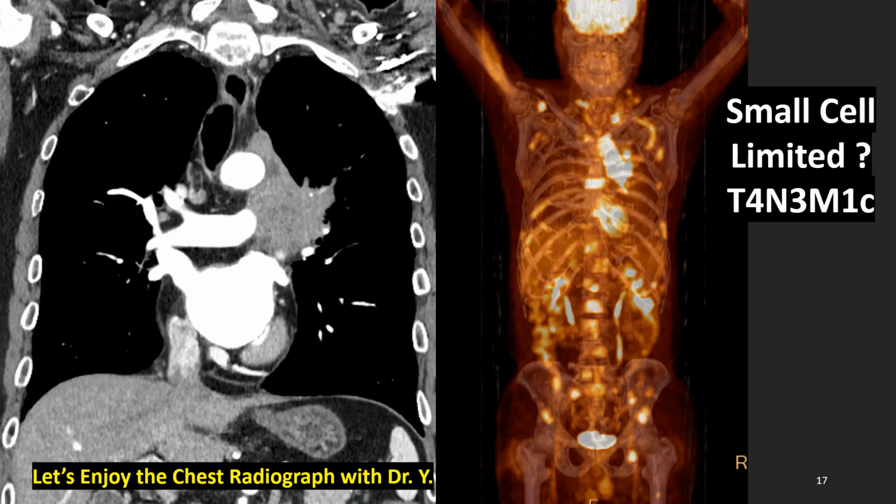With this coronal chest CT, the mass is almost the same as on the chest radiographs, a conglomerated left hilar and suprahilar mass. So it is staged as limited. It was mistakenly staged as limited stage, not extensive stage.